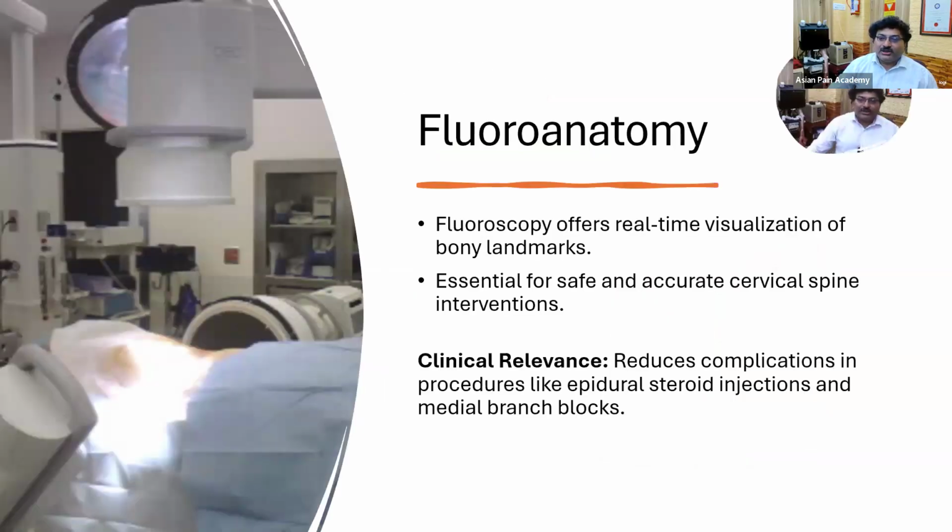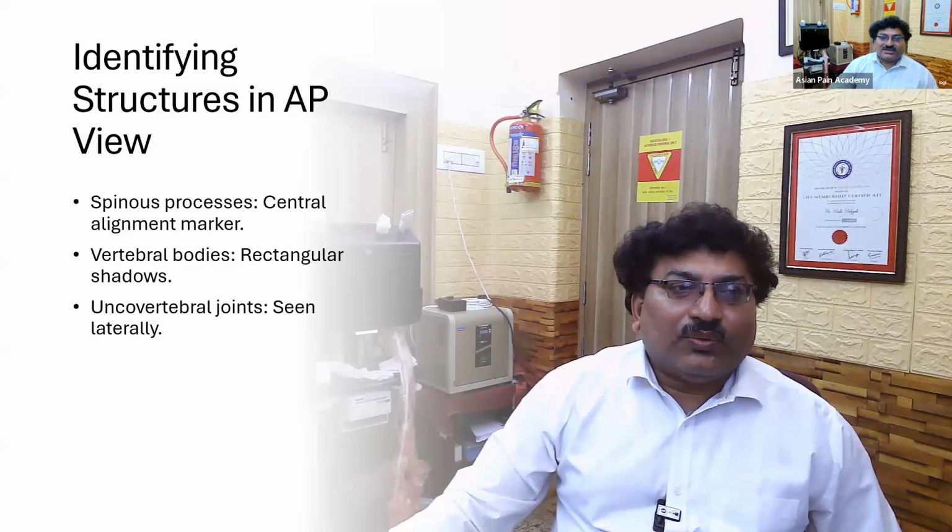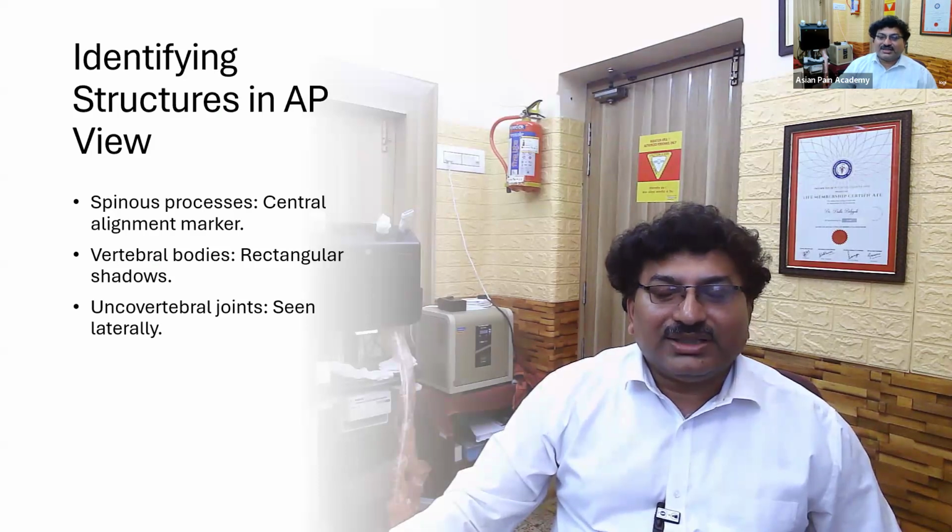Now, fluoroanatomy offers real-time visualization of the bony landmarks, essential for safe and accurate cervical spine interventions, and it reduces complications in procedures like epidural steroid injections, medial branch blocks, and all the cervical procedures we do. Now, what are the structures we can see? We can see all the bony structures that I have shown.